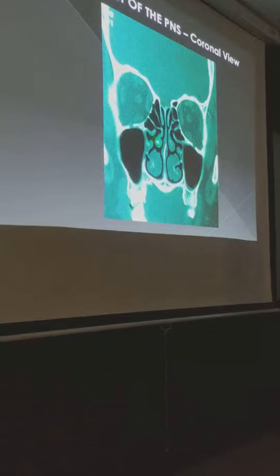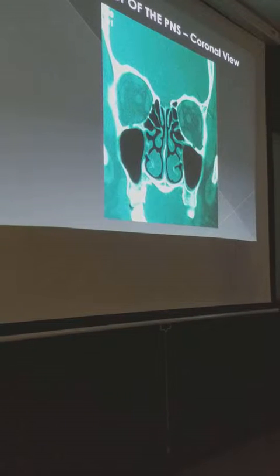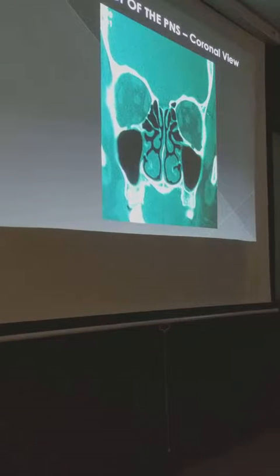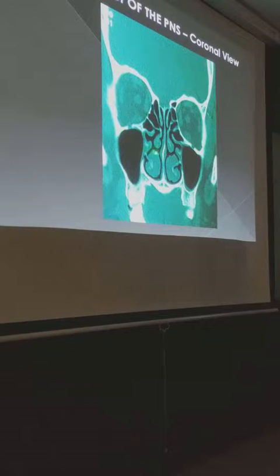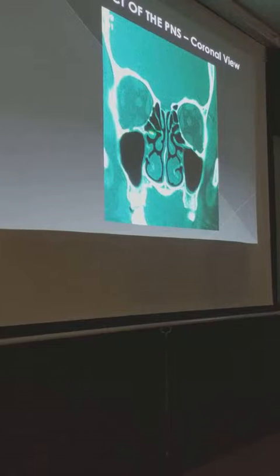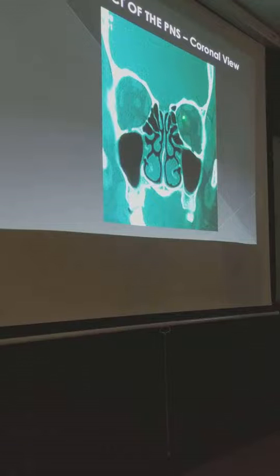So that is now your middle turbinate. Saan ang lamela niya ngayon? Yun. Isa. Dalawa. Anong shape? Anong direction? Oblique. So anong tawag mo doon? Ground lamela or lamela. So this cell here is still part of your ethmoid, anterior. Diba? Kasi beyond this will be your. So, yung na-promise ko sa inyo, nakita nyo na, yung skull base nagsisimula na mag-flatten. Agree?